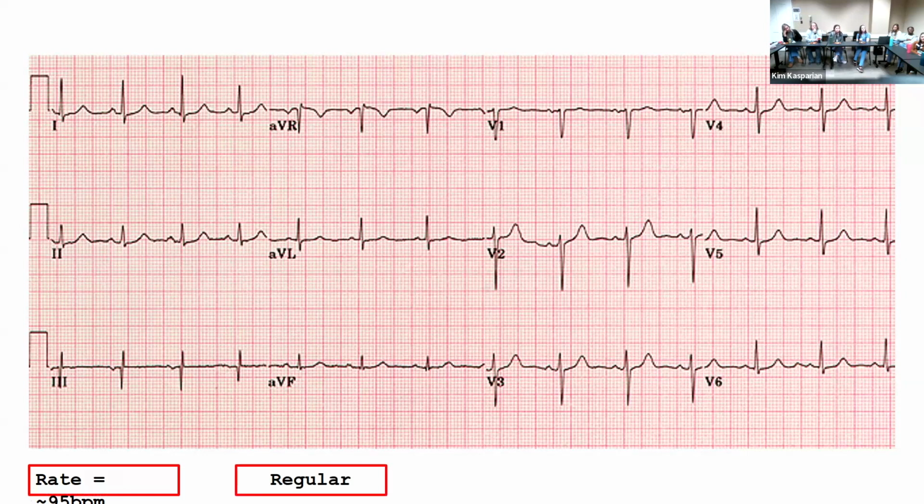There's a couple ways you can measure that. You can take a piece of paper. If you've got a paper EKG, take a piece of paper, mark the edge of it with a couple of the R waves, and then see if it marches out. But also, have any of y'all used the calipers? Y'all know about the calipers? Okay, yeah, use your calipers. They're great. All right, narrow QRS.